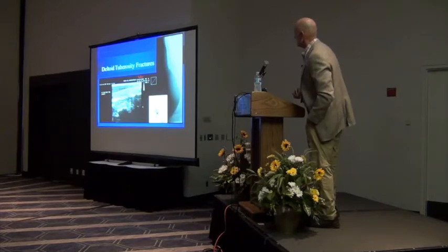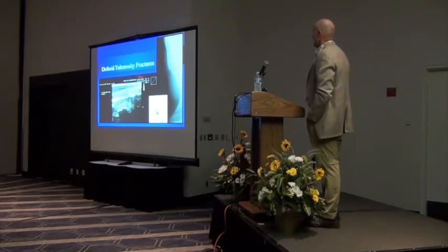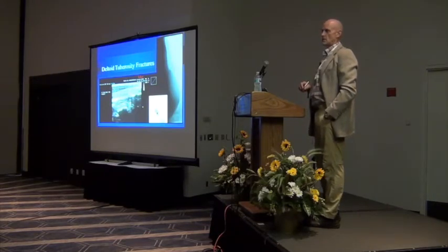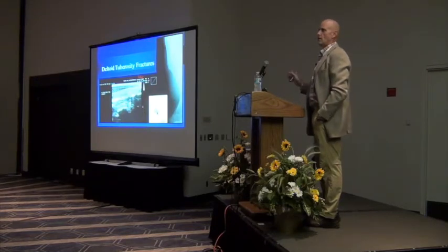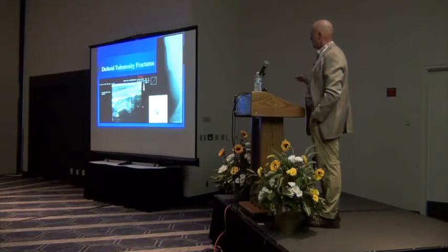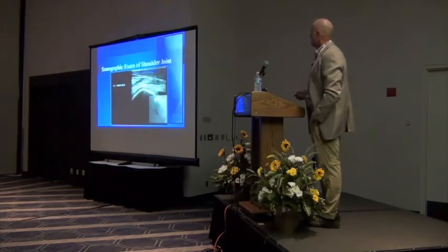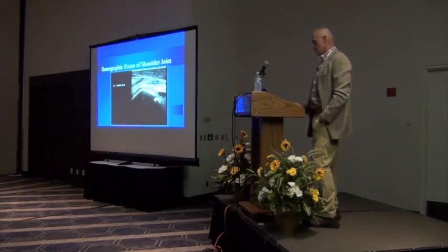And just a little talk about deltoid tuberosities. There is quite a bit of variability in how a deltoid tuberosity looks. I would strongly suggest you look at the other side as well. But this one is quite irregular, and confirmed on bone scan that there is certainly a lot of reaction associated with the deltoid attachment.